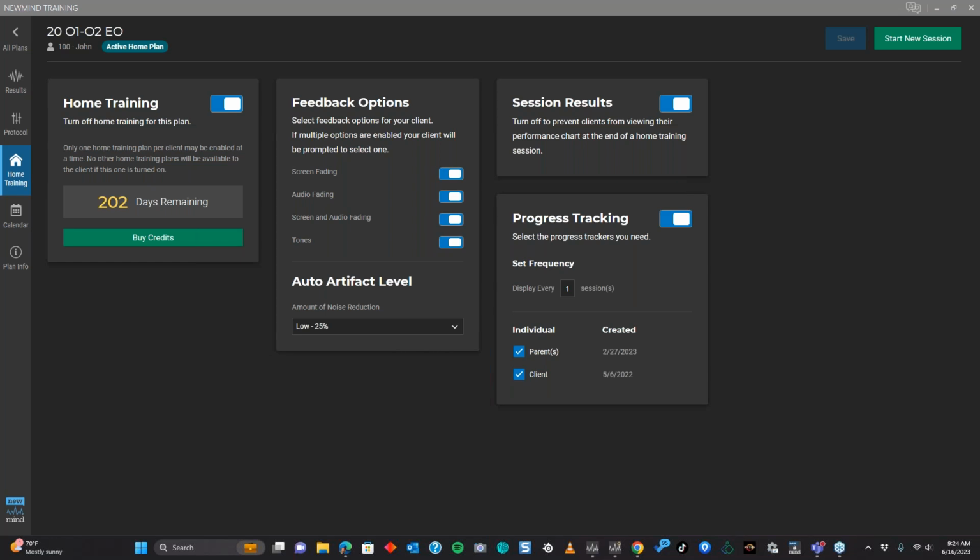It made my job a lot harder because artifacts showed up in trend lines and in average amplitude at the end of the session. So it wasn't as easy from a technician or clinician standpoint looking at change in brain activity simply off the ending screens. But the client still trained and had a lot of success.